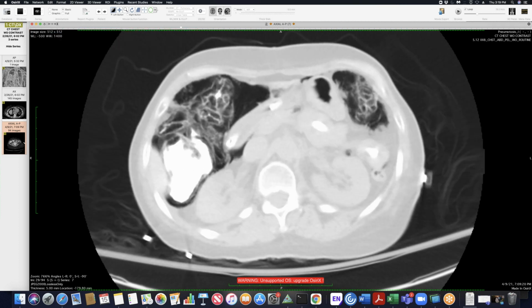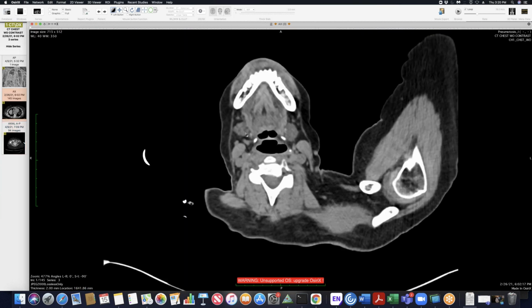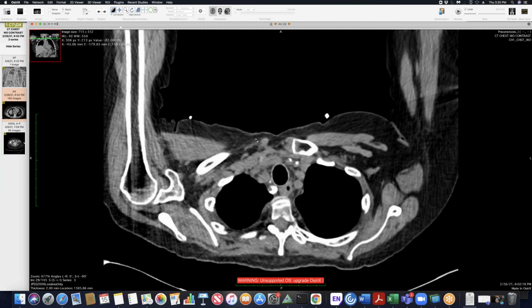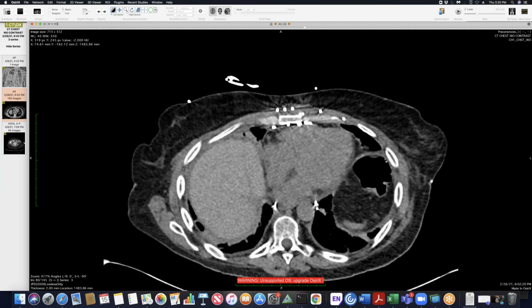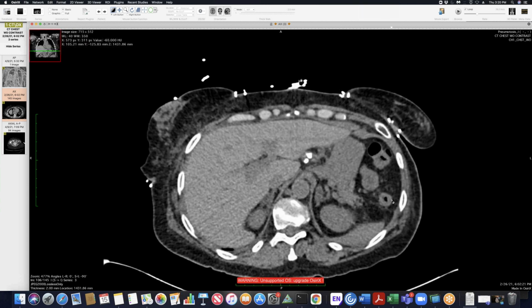And then here is the follow-up abdominal CT. It was done immediately after the X-ray. And here you can see the pretty impressive pneumatosis. So this patient was taken to the OR. They did a laparoscopy immediately, because they were concerned for bowel ischemia, but the bowel is all viable. So this was established to be benign pneumatosis, and the working diagnosis is that it's related to CellCept, which the patient's on for immunosuppression for his lung transplant.